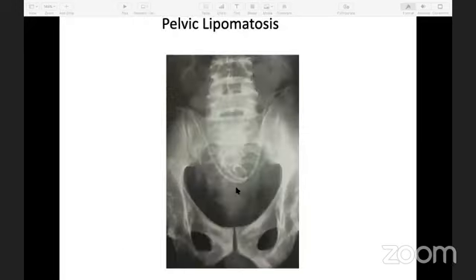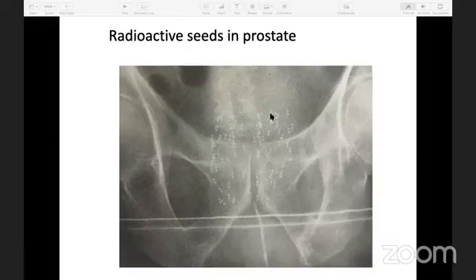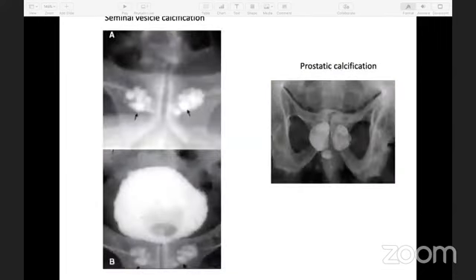Bladder base and trigone are elevated, evident from the position of bilateral DJ stents. Middle portions of the DJ are far too lateral, further suggesting tortuous and dilated ureters resulting from obstruction. Multiple calcific shadows seen in the prostatic area in a case of localized CA prostate treated by brachytherapy. From the location and configuration of the organ, you can very well differentiate seminal vesicle calcification from prostatic calcification.